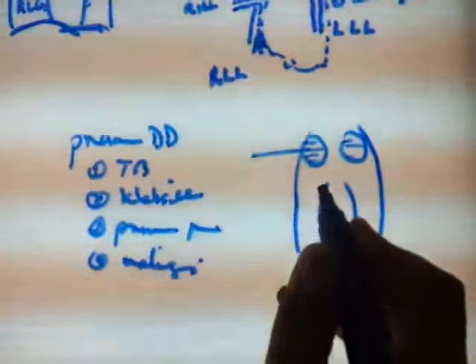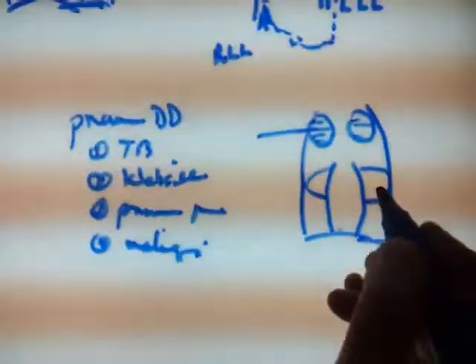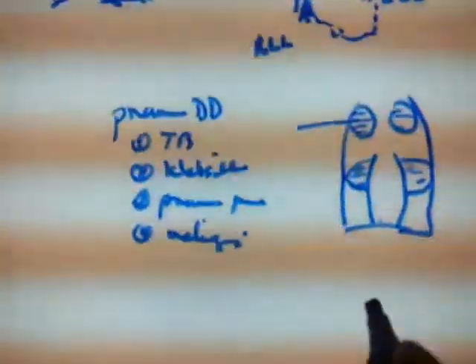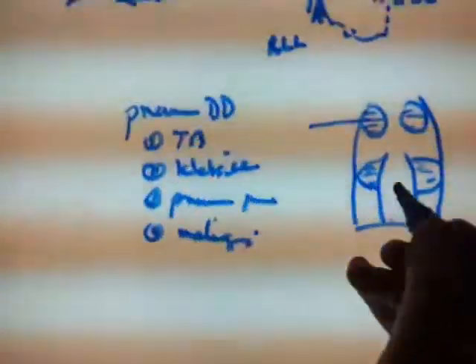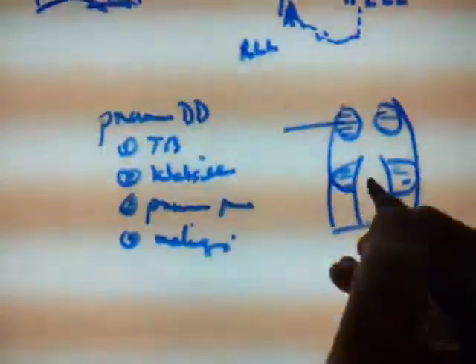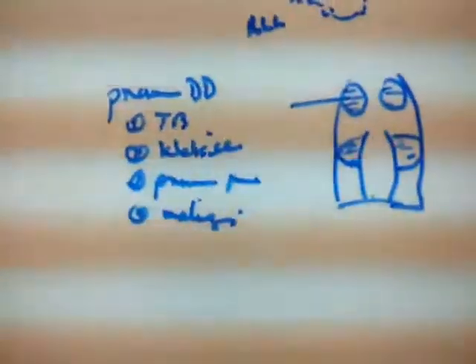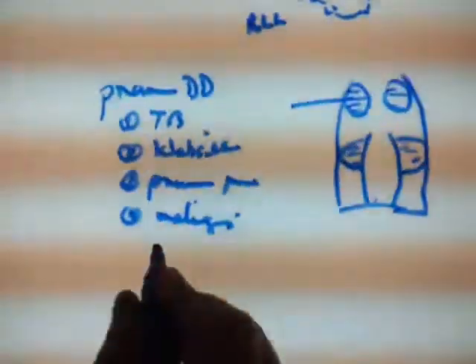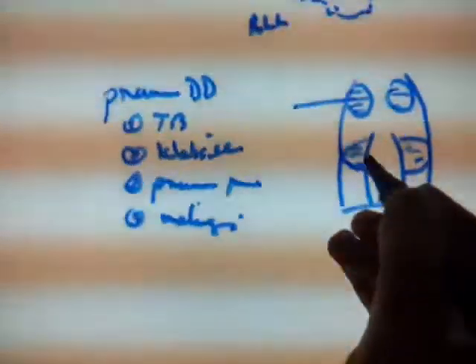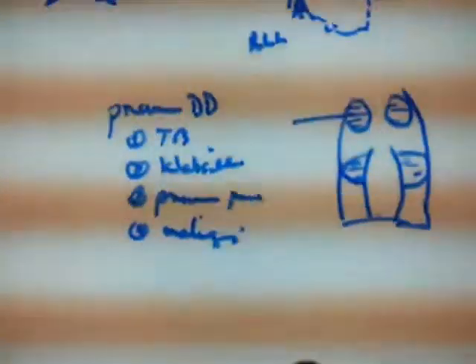If pneumonia occurs in this part of the lung on both sides, just like a wing, in the mid zone, it is a bronchial consolidation, and clinically it is pneumonia. Could be pneumococcal pneumonia. Could be what? Pneumocystis carinii.